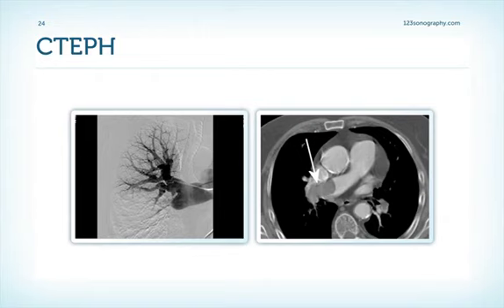The diagnosis is usually confirmed by CT scanning, so have a look at the CT scan on the right side. The arrow indicates contrast sparing, reflecting a huge thrombus that got stuck in the pulmonary artery of this patient. On the left side you can see a pulmonary angiogram that's nowadays only rarely performed to make the diagnosis, but it's pretty impressive as in this case because it shows a huge perfusion dropout of almost half of the lung. Well, you've probably noticed that the pictures are not from the same patient, but should give you an idea of different methods of diagnosing pulmonary embolism.